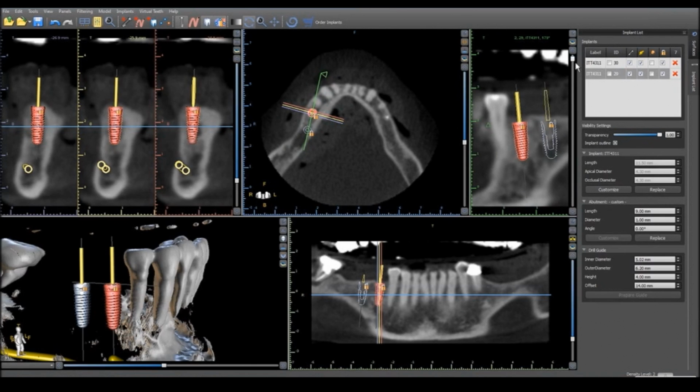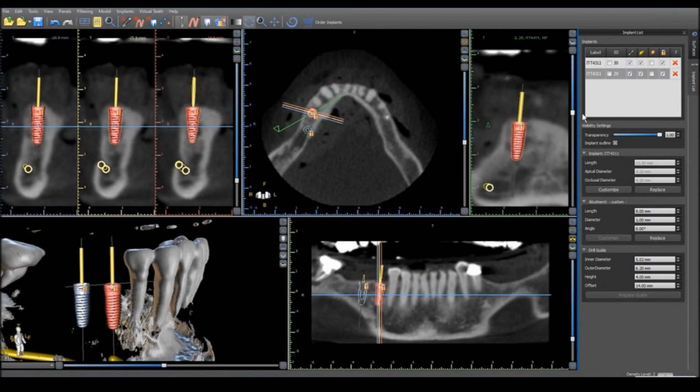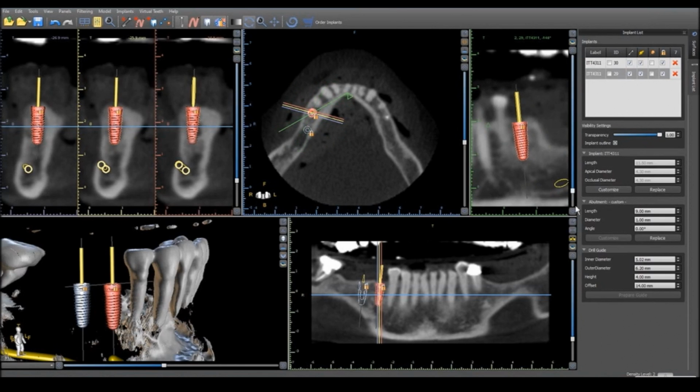So on any structure, you can place, you can activate, and you can center it in this field, and you can see the relationship between all the adjoining structures. Very, very powerful feature. As you can see, also, we outlined the mental foramen and the inferior alveolar nerve. So basically, all the important anatomical features are known when you go into this surgery.